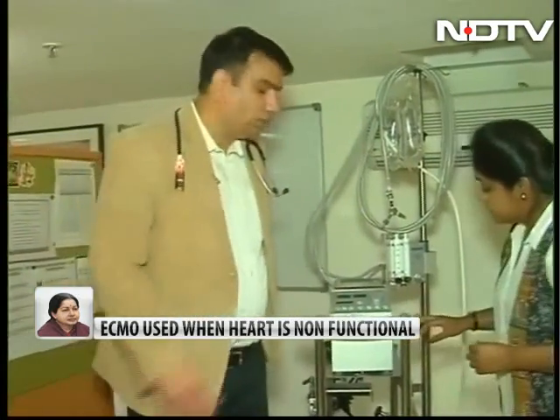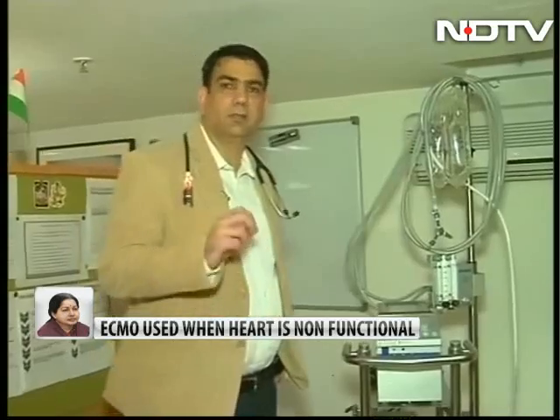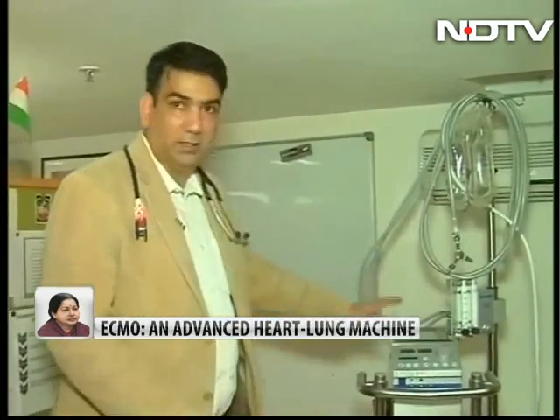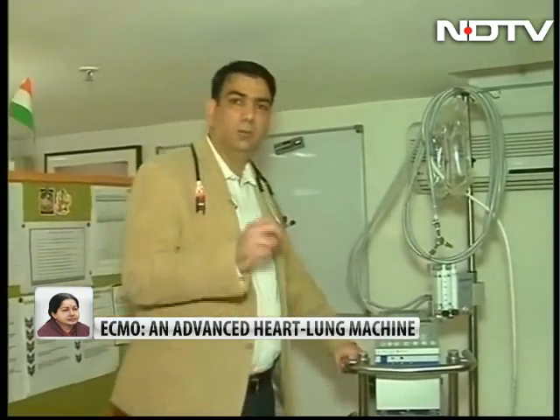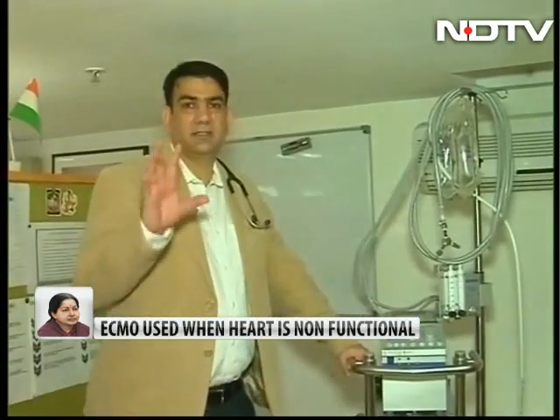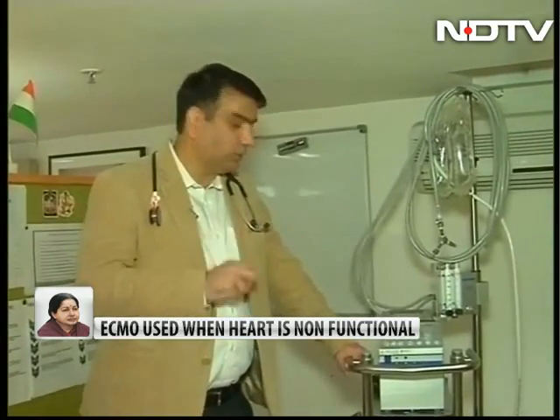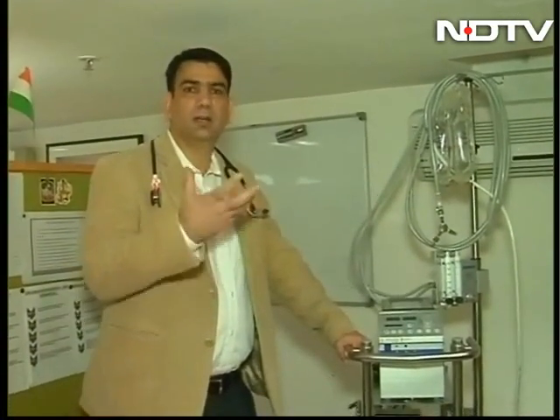All right. So the word ECMO stands for extracorporeal membrane oxygenation, and this is one of the ECMO machines. ECMO is basically of two types. It can support your heart and it can support your lung as well. When the ECMO supports your heart, we call it veno-arterial or VA ECMO. When the ECMO supports your lung, we call it veno-venous ECMO.